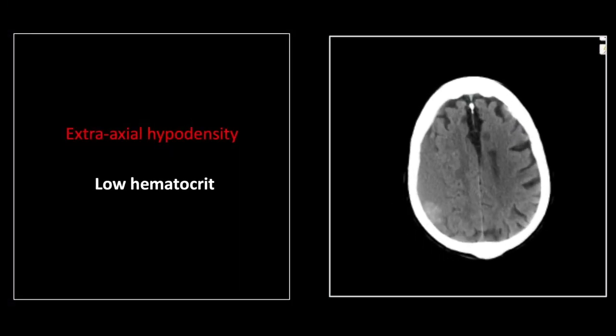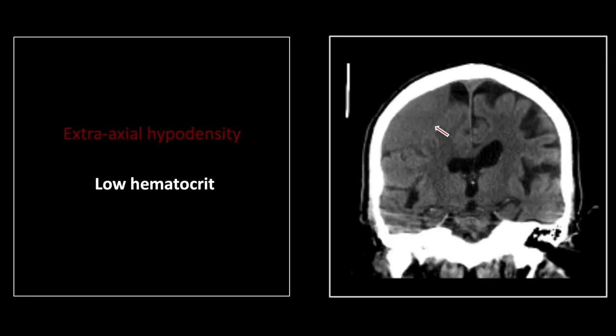Our next case is an unusual hypodense epidural. You can see the extraaxial density here markedly less visible due to its reduced density. There is, of course, a focus of increased density posteriorly, consistent with clot. Its size is readily appreciated here, as is its lentiform shape. You can see this patient had significant atrophy, was probably more at risk for a typical subdural, but had a fall and was able to accommodate quite a bit of intracranial hemorrhage.